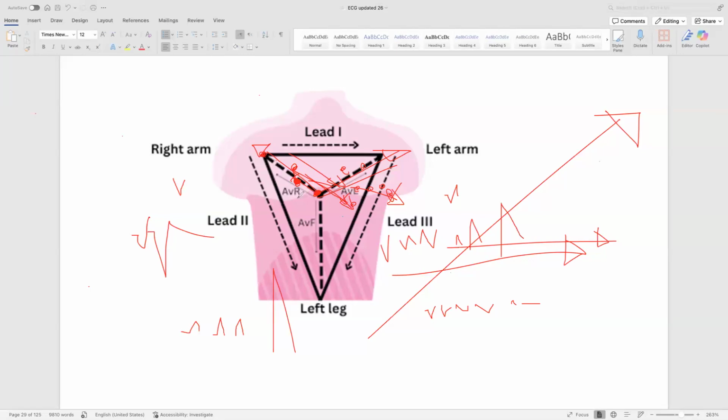This means the transmission of the electricity to the electrode outside the skin has some barrier in between, either fat or water or blood. Either cardiac tamponade or there is fatty tissue. Okay. Now I'm talking about poor R wave progression.